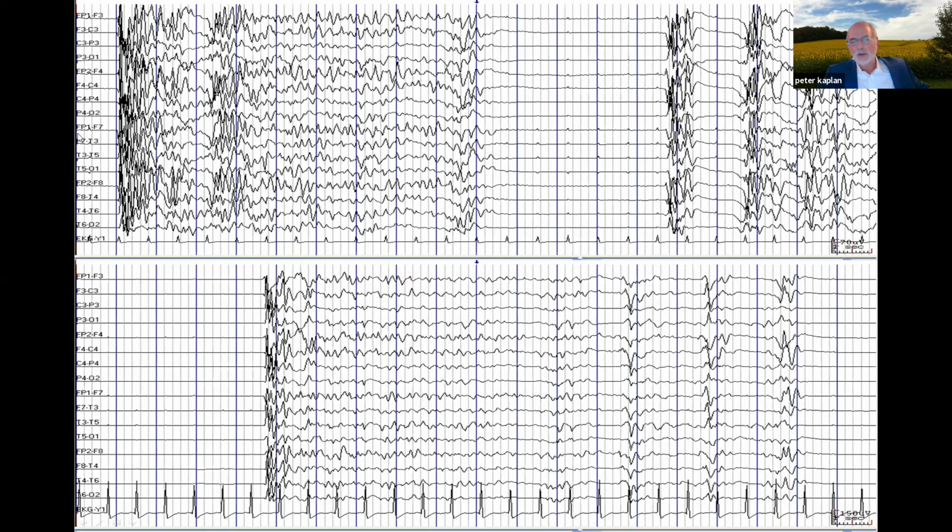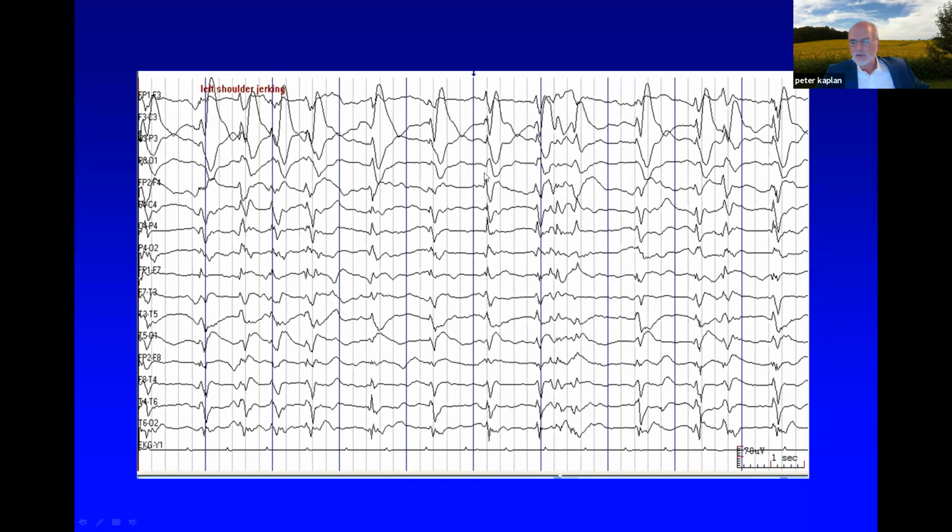Here you see up here what looks like a seizure, and indeed was. The patient had a tonic-clonic, or rather a clonic event, and then went into a suppression pattern, then had the burst suppression, and then it started again. So these things evolve one into the other, not specifically etiologically linked, but this is typical of anoxia. These are generalized periodic discharges, but if you have twitching, it is called an epileptic seizure, with the correlate that it isn't just an EEG finding, you can call it a seizure, and this pattern would be called status if it continues, all right?